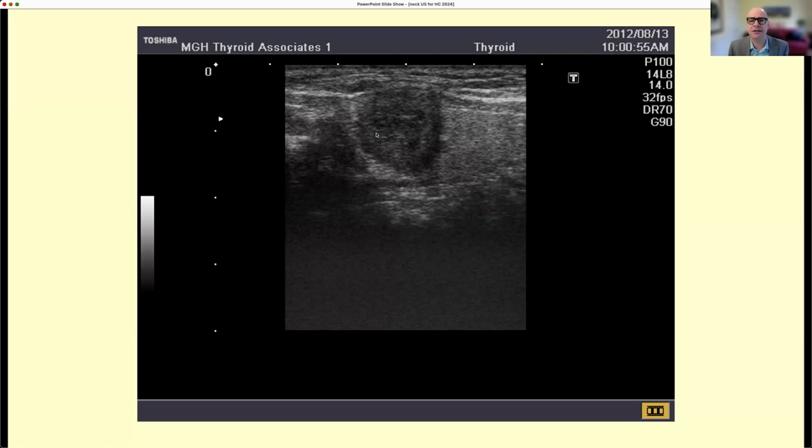You see how it's taller than wide? Yes. So I explained to you that when the diameter is taller than wide, it's a marker for malignancy. I don't know whether it's extrathyroidal, but it is certainly on the thyroid capsule. And so this is a nodule that you have to be worried about, even though it is small. I brought this up only because it's taller than wide.